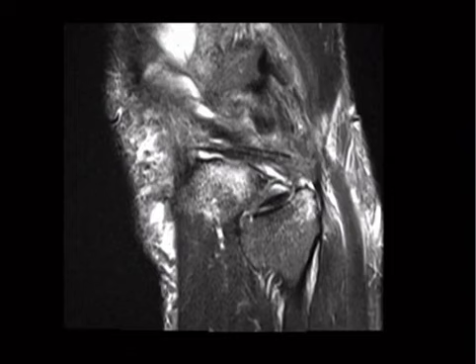Now, the posterior lateral corner is one of the most complex parts of anatomy in probably the entire body. There's like 37 structures or something in the posterior lateral corner. There's a lot. Too many to remember and too many to be tested on. If you were going to show posterior lateral corner injury on multiple choice, the way that I would show it, and the way that I look for it in the real world, is I look for edema in the fibular head. And then I would say something like, correlate for instability in the posterior lateral corner. Boom, next case. But right there, that would be the way to show it.